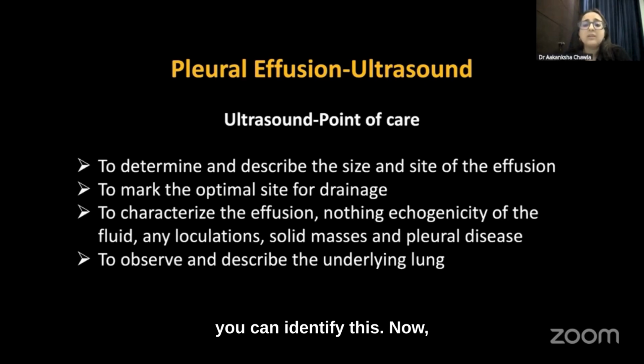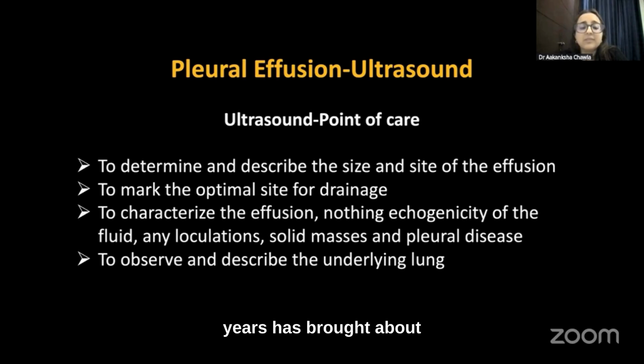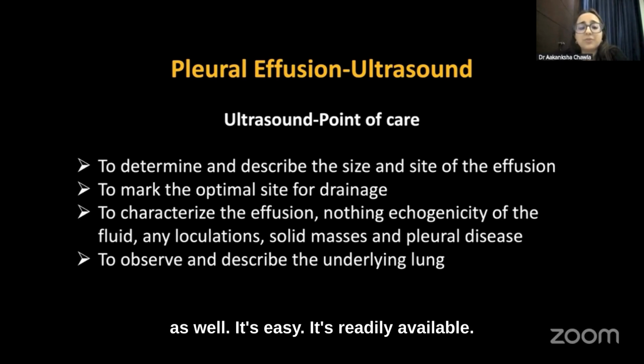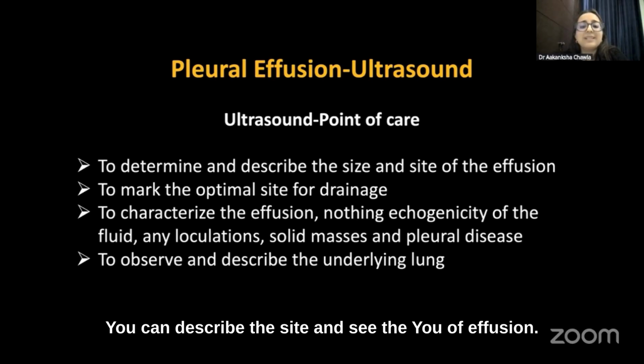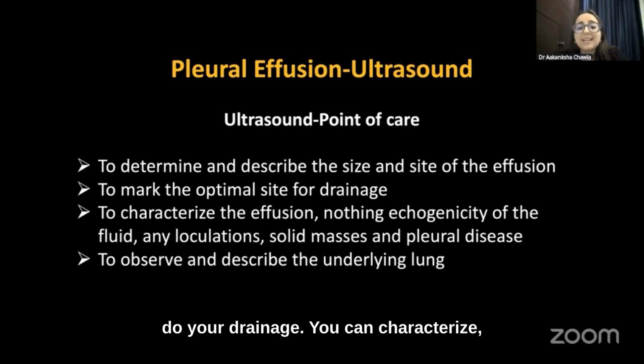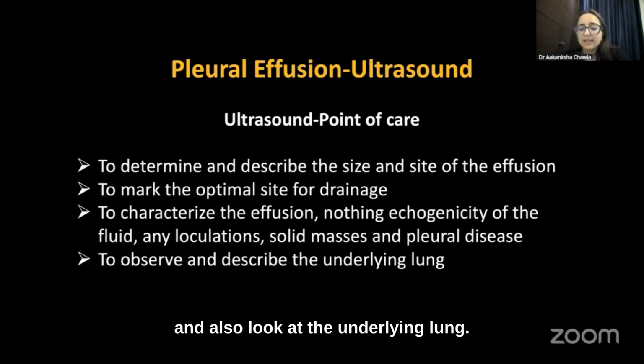Now, we've talked about X-ray. The presence of ultrasound these days, for the last 20 years, has brought about extensive use of ultrasound in pleural effusion as well. It's easy, it's readily available, there's no radiation exposure. You can describe the site and size of effusion. You can use it to identify the space from where you need to do your drainage. You can characterize, you can look for loculations, presence of any solid masses, and also look at the underlying lung.